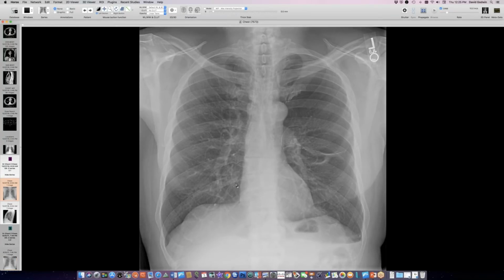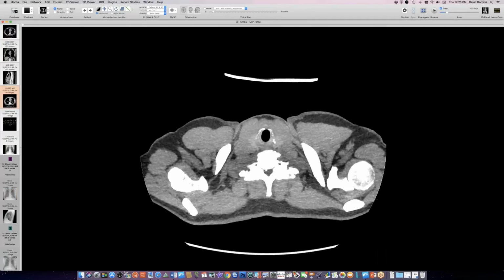he had a pneumothorax. Now, the pneumothorax was asymptomatic, and that's this month or last month, December. It was picked up because he had some hematuria. So it turned out that he had pneumothorax on an abdominal CT, and it's actually a hydropneumothorax. And this is the radiograph then that we were dealing with. Let me show you his CT scan.